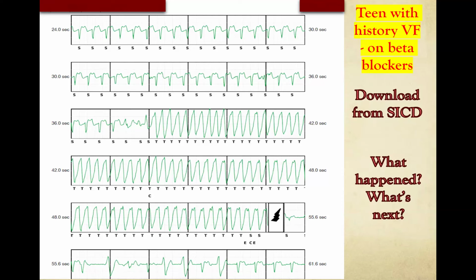And typically what we would in a perfect world want is for the patient to be in the arrhythmia long enough to faint, so that when they get shocked, they don't actually feel the shock. This episode, I believe, according to the patient, was felt by the patient. So presumably they had not yet fainted. Although I think we can predict that if it had gone on a little longer, probably he would have fainted, or she would have.